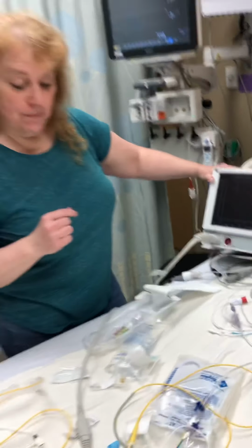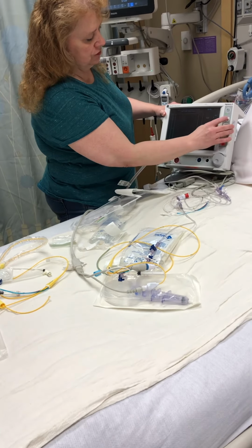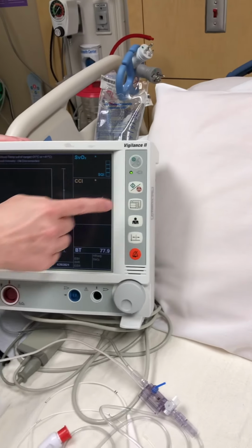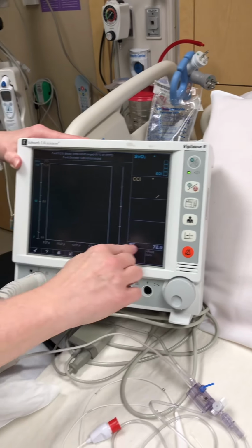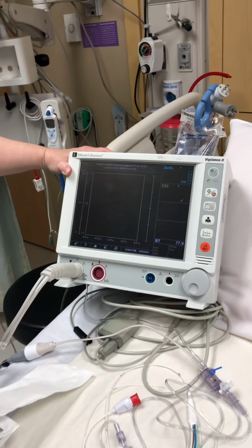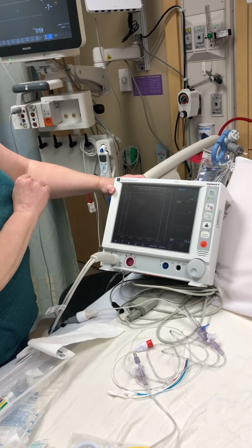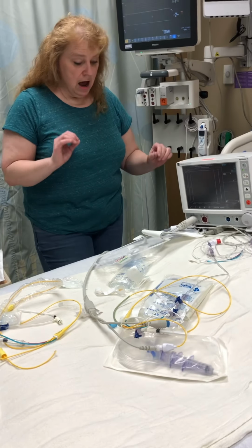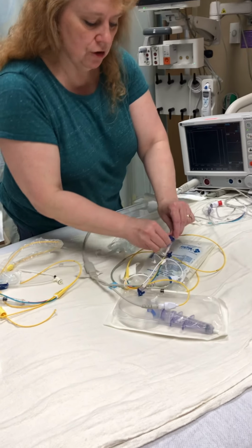When you get it set up in the patient, you're going to turn the on/off button. Right here it's saying out of range, but this is the on/off button to start your monitoring, and it'll say collecting data, collecting data. It'll say collecting data, and then you'll have your readings there. So that's our continuous cardiac output. Our manual is a little bit different. I'm going to go ahead and show that.